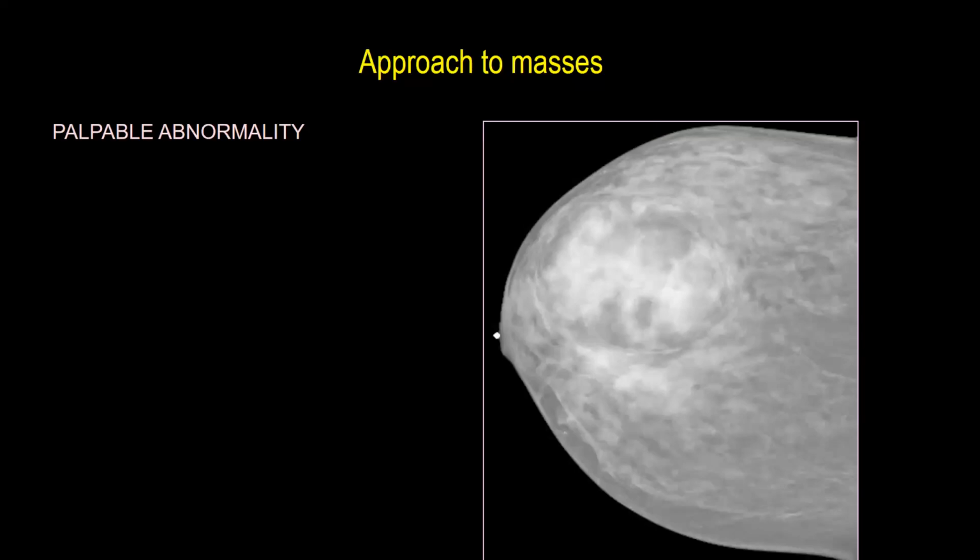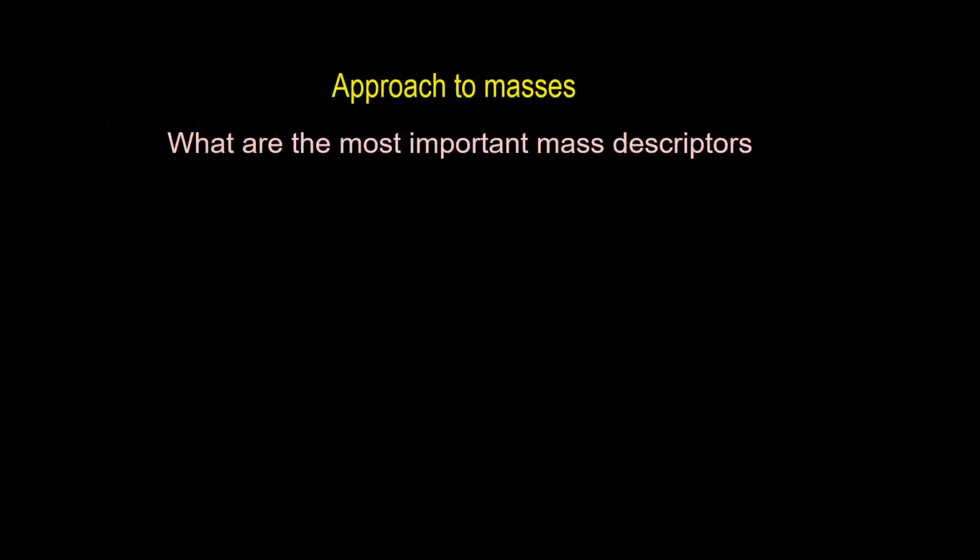I will just say a large hamartoma, a mixed density mass with features of a hamartoma, not associated with any suspicious features. So this is a hamartoma. This is a BIRADS 2. Straightforward. No need to describe it more. Since I say no suspicious findings, that is it.